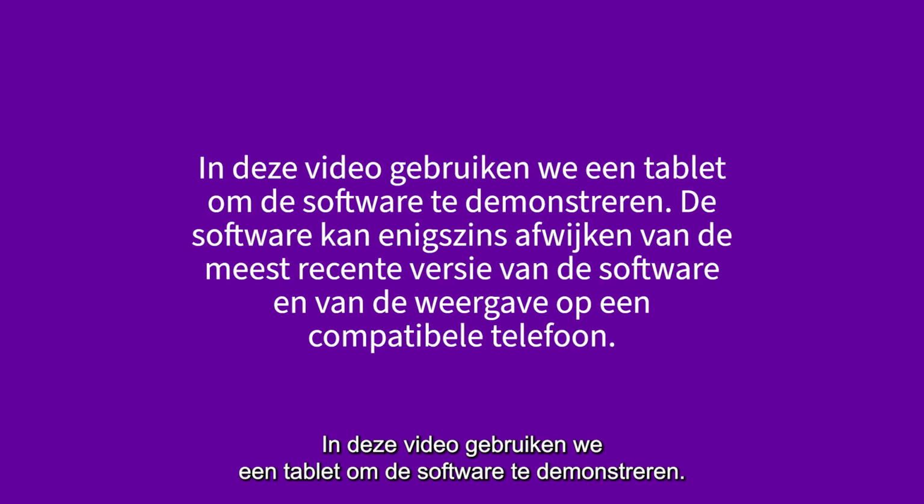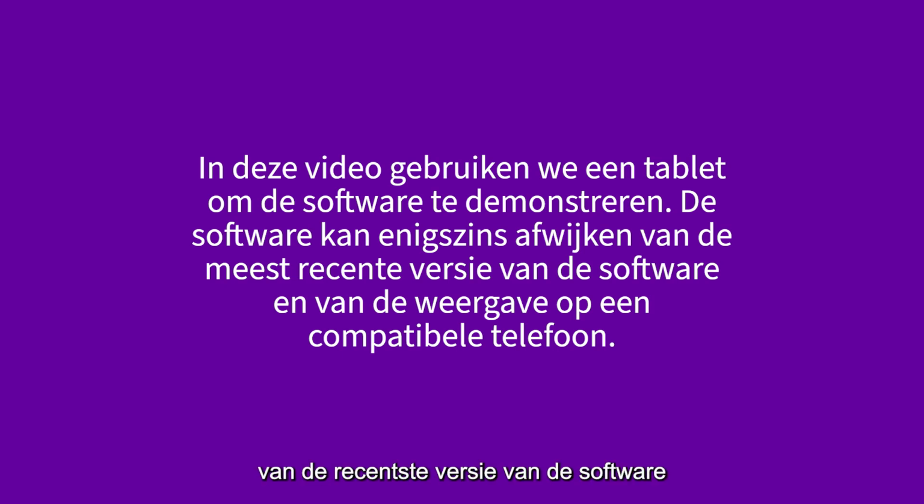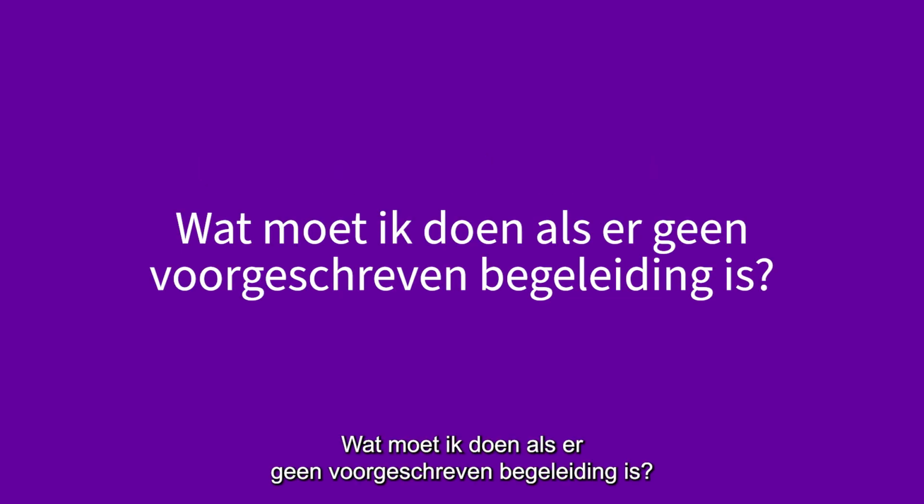In this video, we use a tablet to demonstrate the software. Please note that the software may appear slightly different from the most recent version of software and from the view on a compatible phone. What should I do if there is no prescriptive guidance?